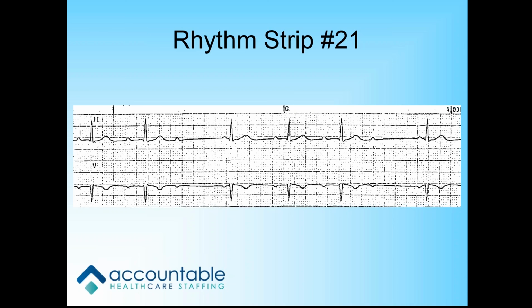Now, one of the things I want to point out to you, Eleanor, you did a really good job of identifying all of the components of the rhythm strip. And you knew you were in a block. You just weren't certain which one it was.